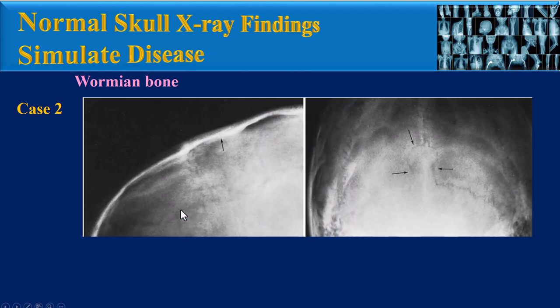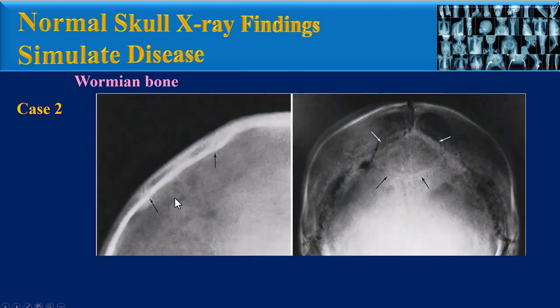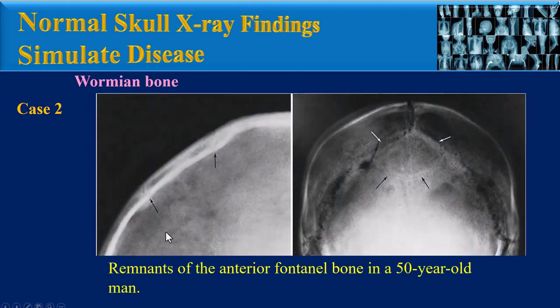Another example which shows a closing anterior fontanelle bone in an 11-year-old boy. And another example, we can see remnants of the anterior fontanelle bone in a 50-year-old man.